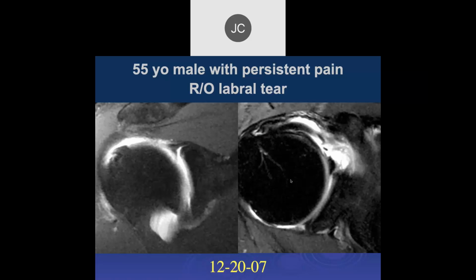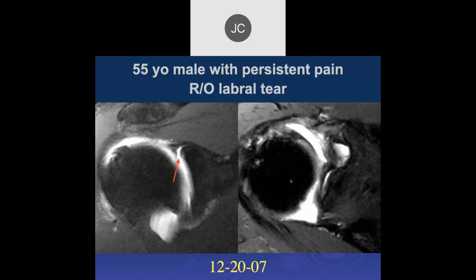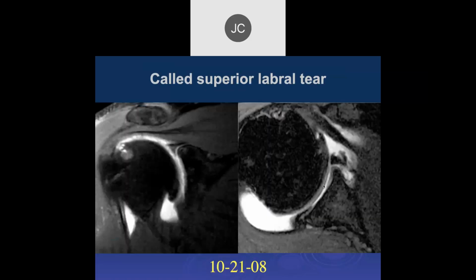Mm-hmm. Okay, this is 12/20. They were concerned about a labral tear here. Okay. Okay, so more inferiorly on the right. Is there some fluid there undercutting the labrum, or? Yeah, that's right. Okay, so this is 07. This is 08.